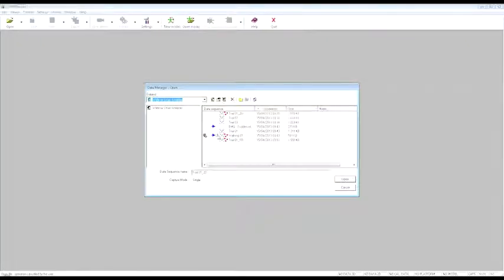Or we can have the icon relating to the force vector. That means that we have also kinetic data that have been recorded within this trial. And so on. We can know about every portion of data that we can find inside each trial just by looking at the related icons that are displayed close to the name of the trial. So I want to start by loading the trial first.